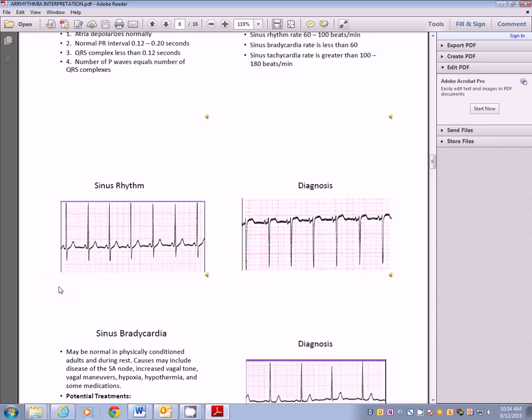And they do walk off. Your P's walk off and your QRS's, so it is a normal rate and rhythm. Then you would go back and measure your PR intervals. And again, with this, I would hold up a piece of paper, and I would know that it starts at the beginning of there to the beginning of the Q. And if you looked at that, again, it's hard to see with these small boxes, but it looks like it's around 4 boxes. That would be normal.